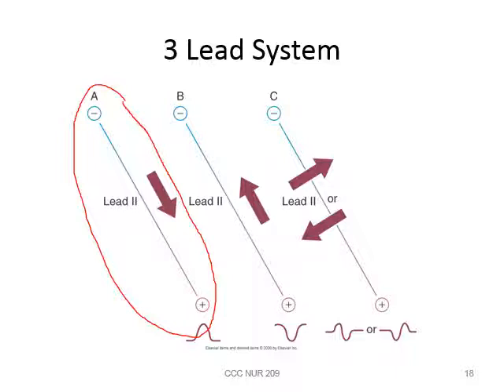It gives us the most proficient looking EKG. We get the best looking P waves and QRS complexes from a lead 2. So typically you're going to see most monitors set in a lead 2 setting. Again, lead 2 just means the angle we're looking at the heart. Lead systems are the number of contacts that are on the patient.